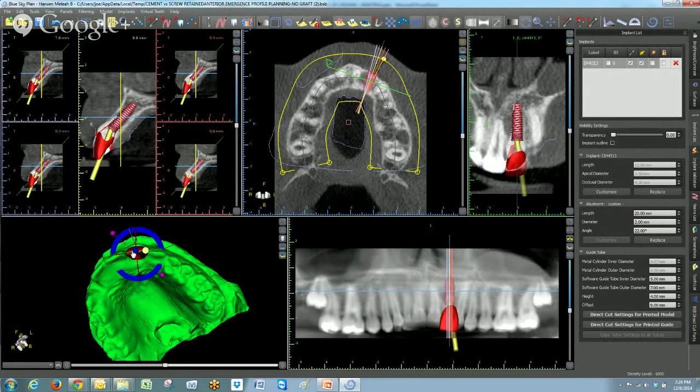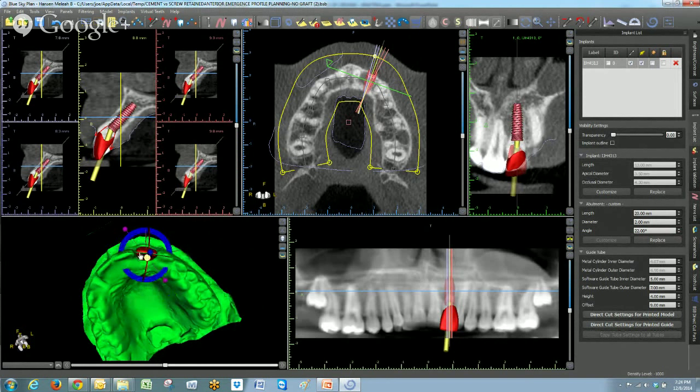We have this little wheel here that we can turn. That's the tooth. We want to use the implant itself, or this wheel, and we can turn this to line up properly. And the way I know that it's lining up is you'll see this red line or an arc. If you look at it this way, you'll see it. That pretty much determines the way that the abutment is going to move facially or lingually.